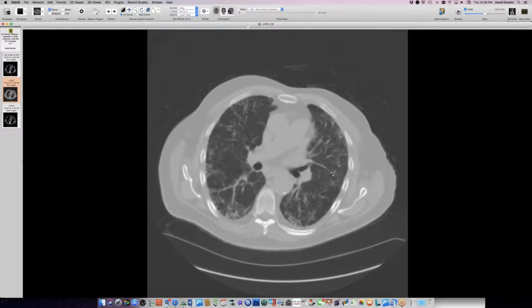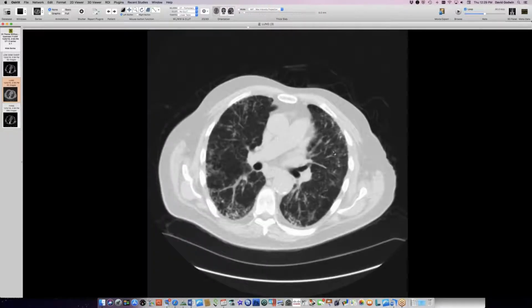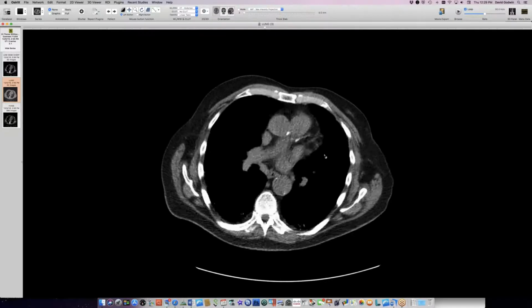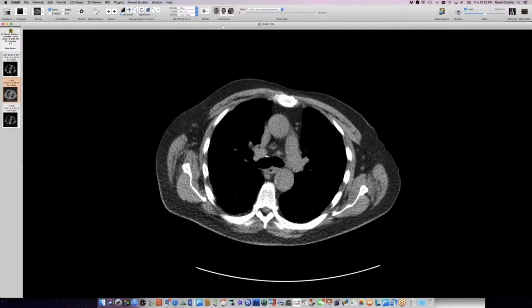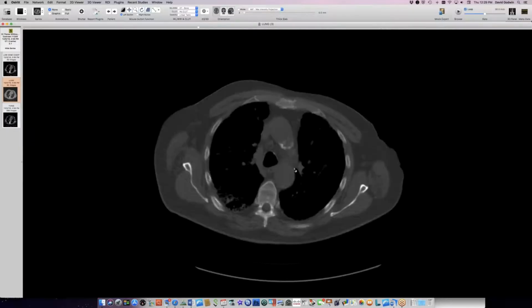He had a beryllium sensitization test, and that was positive. So this is probably berylliosis in this fellow. You kind of wonder if there's some calcium mixed in there, but that could just be an artifact. And then he's got some modest mediastinal lymphadenopathy, nothing particularly striking here, nothing that you would look at and say, oh, that's a sarcoid-like pattern. That would also support the idea of berylliosis.